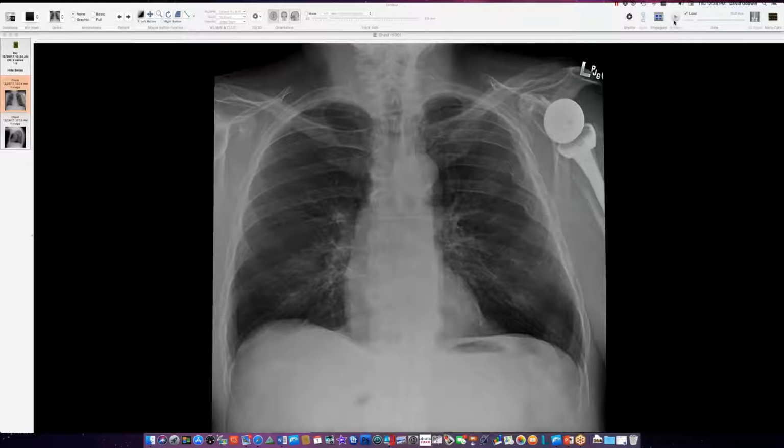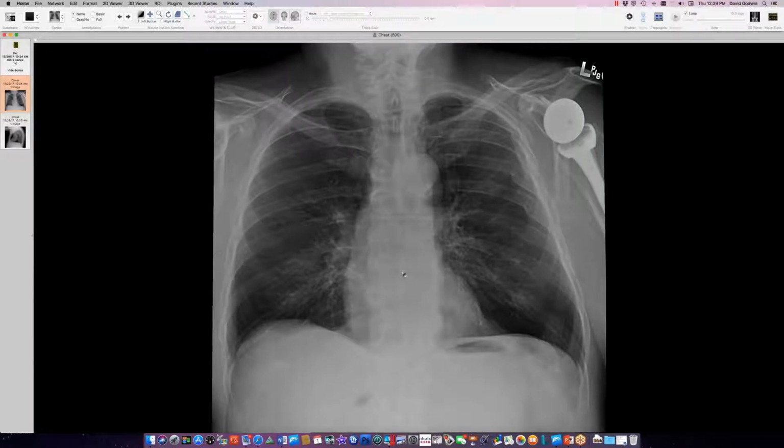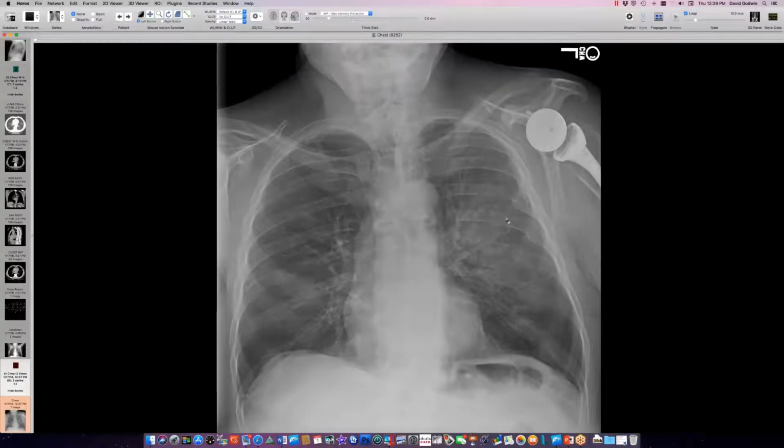Got a couple. So is a radiograph visible? Yep. This fellow had pretty clear lungs at this point in late December. He's had shoulder prosthesis. He's had some rib trauma on the left. And then he started coughing up blood. Let's see if I can advance here. And he presented with this radiograph.